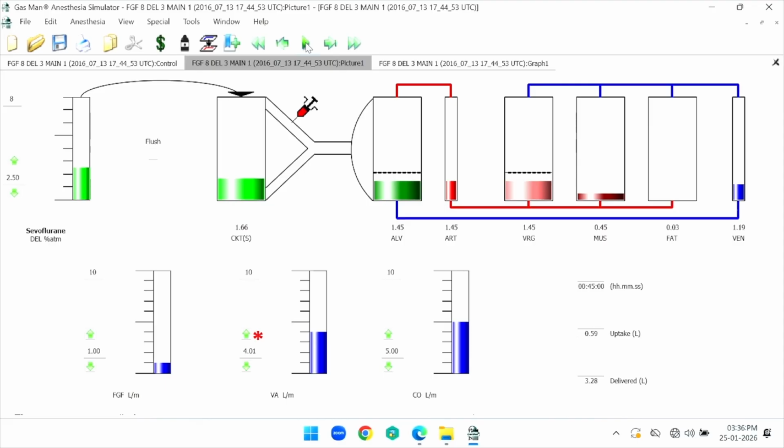It will show you the wastage. How much is it? 465. 465 rupees for 2.5 hours of. No. Achha, it's up to 45 minutes. No, let's see. It will not change much. So 1 hour. Sorry, 55 minutes. We'll see for the.